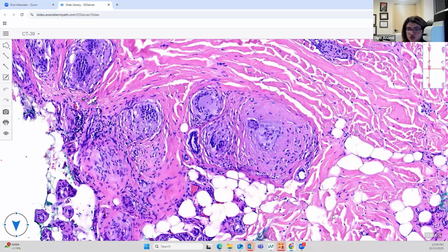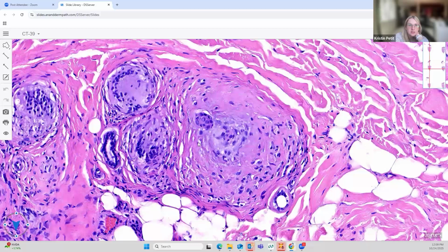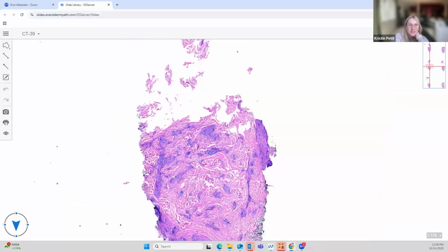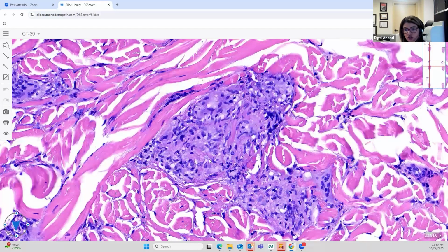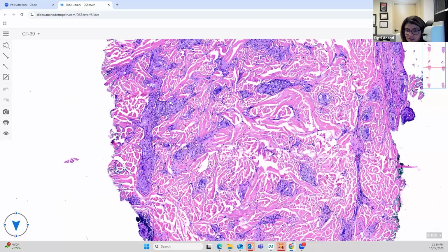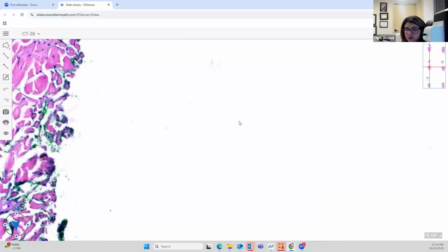Okay. Who wants to describe this one? There are naked granulomas throughout the dermis, so sarcoidal appearing, like sarcoidosis. Yep. This is very classic for cutaneous sarcoidosis. These are tight, round nodular aggregates with lymphocytes, histiocytes, and you see the nice multinucleated giant cell. This is as perfect as it can get for sarcoidosis.